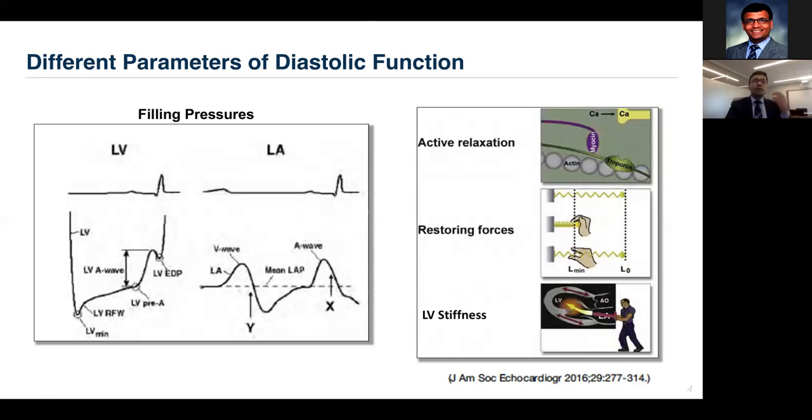And typically during cardiac catheterization, you measure the LV end-diastolic pressure. So the place where there's a notch that you can see, this notch typically corresponds to the LV end-diastolic pressure. But it's very clear that the pressures can be very different depending upon where you're measuring.